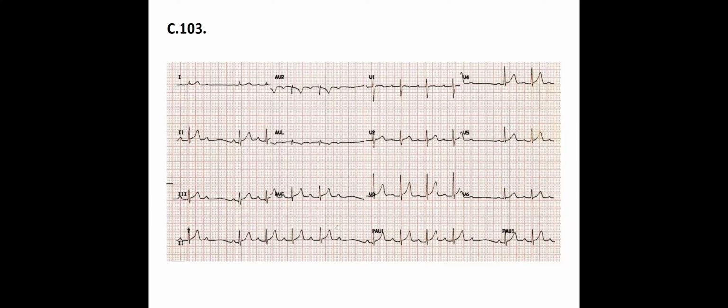Okay, so this is what I said: when you see not only the elongation of the PR, but also an unconducted P. This is the unconducted one, and compare the last PR to the first one. This is what we have to do. If the last one is longer than the first one, you can say that's a Mobitz type 1 AV block. Okay. Good, very good.